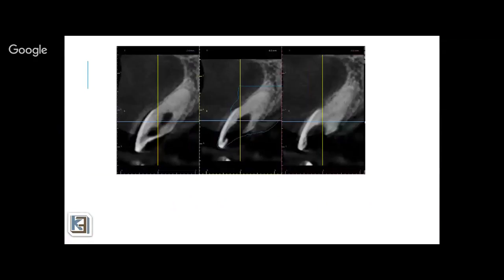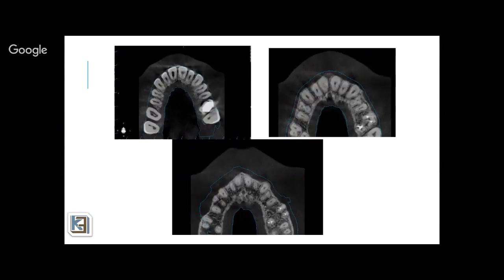Again, these are the slices on the CT scan showing the extent of the damage inside the tooth and sacrificed tooth structure, trying to find that canal. This is a coronal section. You can see how much loss of tooth structure that was gouged and cleaned and taken out. And this shows you the extent of calcification inside in comparison to the neighboring teeth. This is the first slice where you can see the beginning of a canal or the entry point where I would have to plan my drilling path all the way down to this slice to be able to get to that canal.